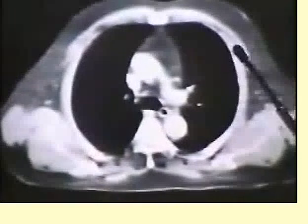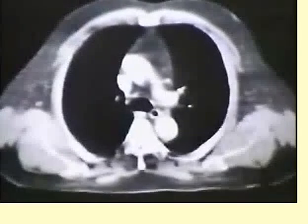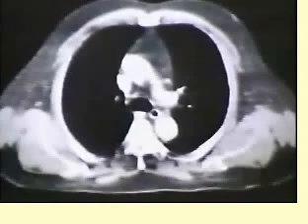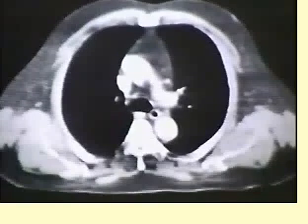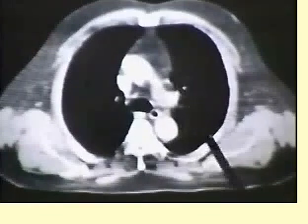Let's look at a scan at a fairly similar level. Here we see that this is obviously a vessel because it runs right out into an intrapulmonary vessel. Sometimes you have to compare the lung window pictures with the mediastinal window pictures in order to appreciate that relationship. The partial volume effect, of course, runs us into the main pulmonary artery a little bit as well.